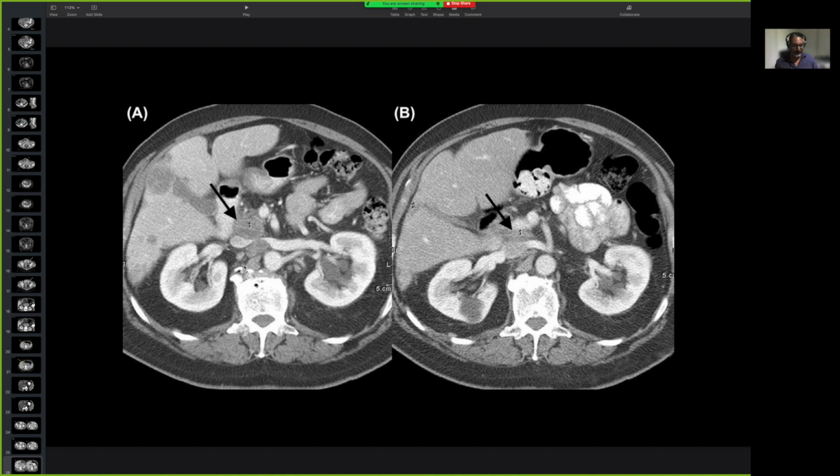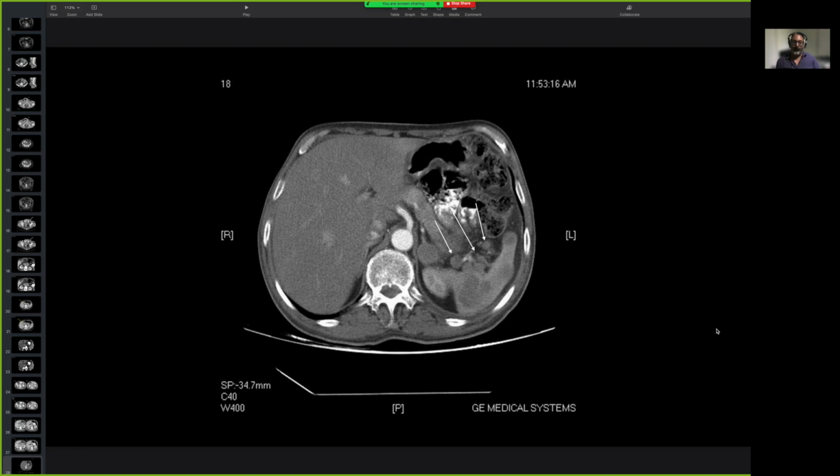Again, what you have here, so that's the aorta. The IVC is a bit further up here. But it's again in the same area. So let's see, portocaval lymph nodes again. Porta hepatis and near the IVC and the porta hepatis. All right, now what's the organ here? Lymph nodes around this area. So what's that organ? If you can remember, splenic lymph nodes.